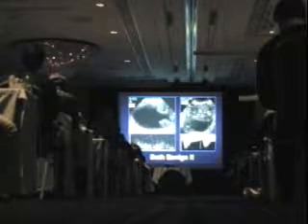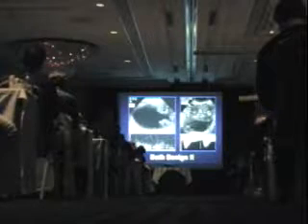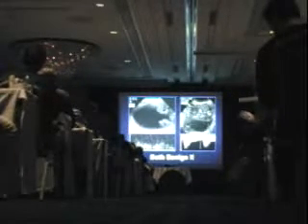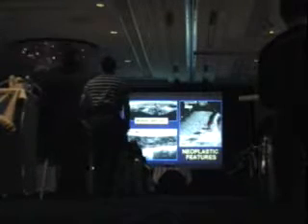So we're certainly not perfect. We're going to overcall. We should overcall because we can't tell. But I hope this gives you something to hang your hat on as far as most lesions we don't worry about. When we are worried, we can look in the ascites for mural implants. We showed this case the other day, a met there, and we can see an implant over there. We can see thickened omentum with bowel displaced here. So there's a lot we can look for in addition to just the ovary.